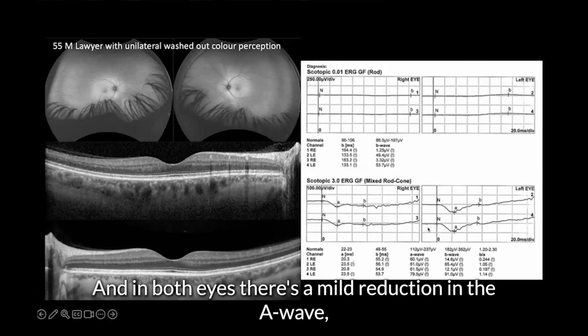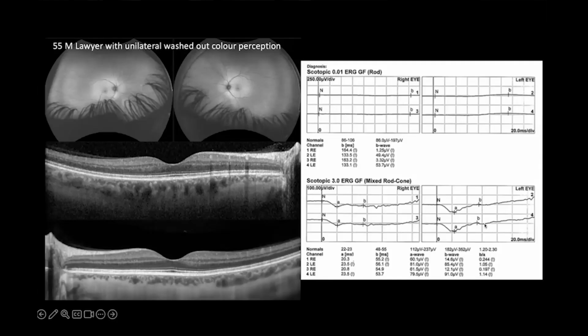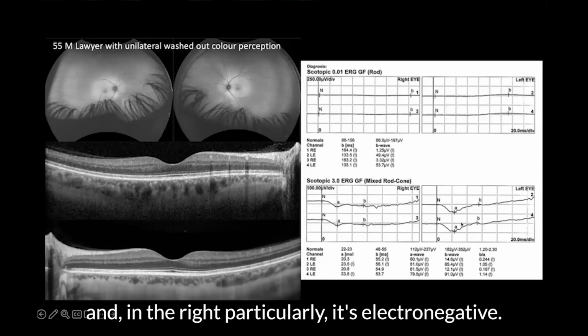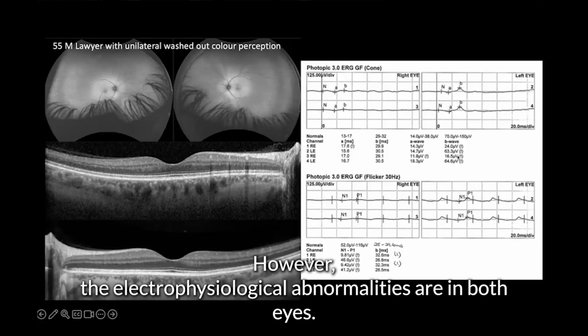And in both eyes, there's a mild reduction in the A wave, suggesting some photoreceptor abnormality, but more importantly, there's loss of the B wave. So both eyes have reduced B to A ratio, and in the right particularly, it's electronegative. This is despite healthy looking retina. So his symptom is only in the left eye. However, the electrophysiological abnormalities are in both eyes.